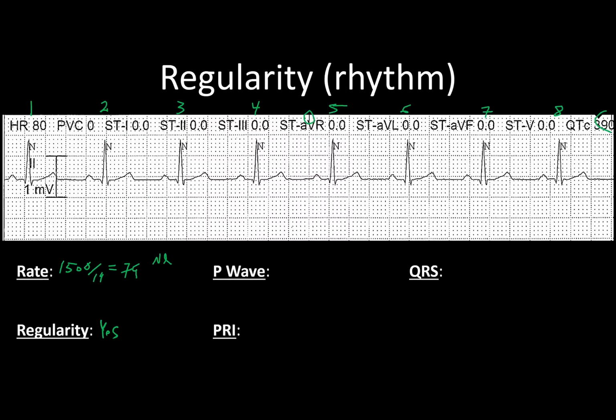All right, so continuing on, I kind of cleaned up the slide a little bit so there wasn't as much gunk in the way, but let's focus on our regularity now, or the rhythm. Is it regular? And we answered that question beforehand saying, yes, this is regular just by eyeballing it. Do we see any patterns at all? And in fact, there are none. It's just really straightforward. So we can say no patterns. And then do I have any ectopic beats? Anything that seems early or late or just out of place? And the answer is no ectopics. And it's really just that simple.